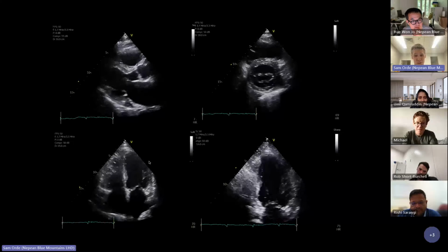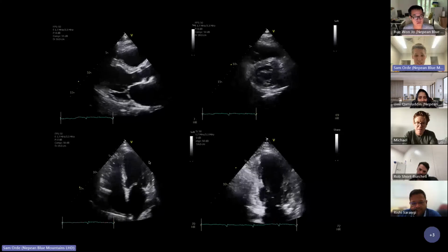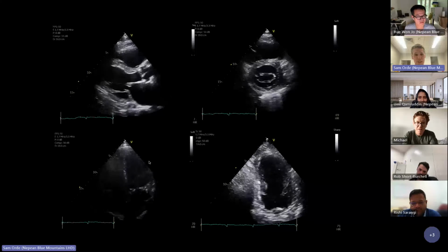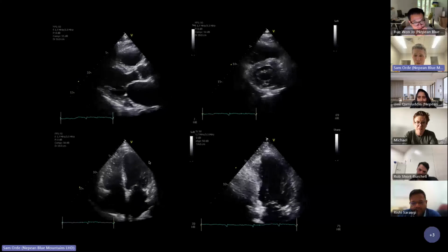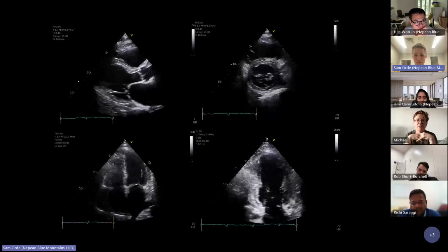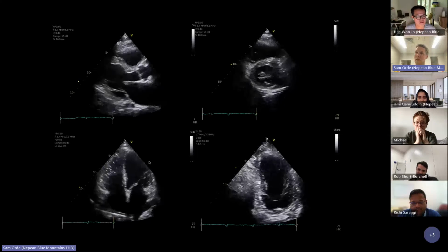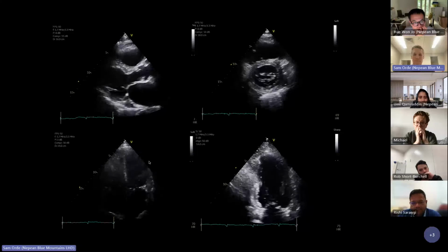The way that we talk to each other is really important, which means that we need to make an assessment as best we can. You may be sitting on the fence, but you're going to have to make a call. Generally, I find that intensivists overcall these things and cardiologists undercall them, and probably the answer is somewhere in the middle. Whoever's the reporting doctor usually thinks they're right. So as we look at this, what do you think of the LV systolic function on this one?